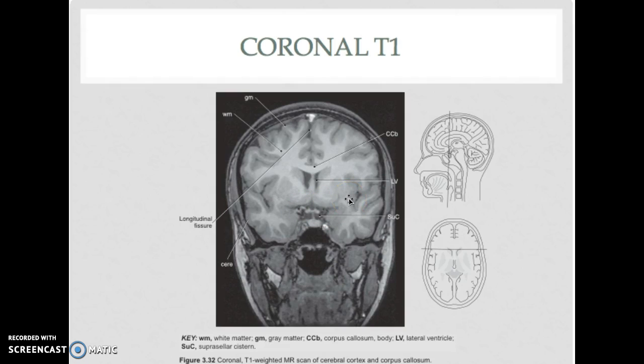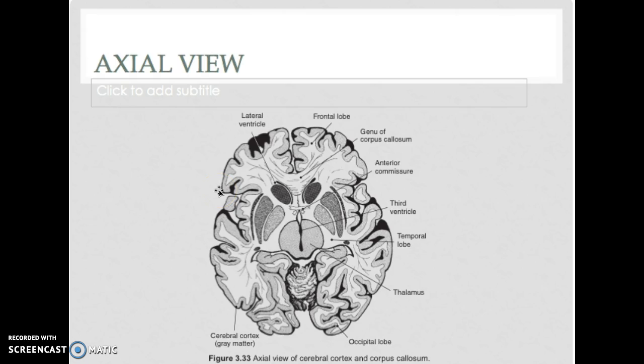So when I talk to you about pituitary adenomas or any kind of pituitary tumor, they grow upwards typically. Hopefully they grow upwards and give you blurred vision, so that's pretty normal. On either side is your internal carotid, so you don't want it to grow laterally, as you'll be in really bad trouble. Here, the lighter gray portion is your white matter and the darker is your gray matter.